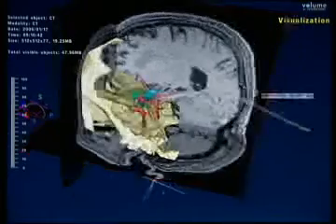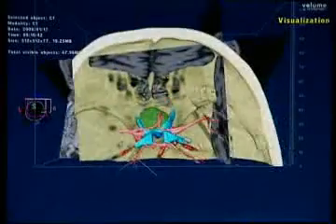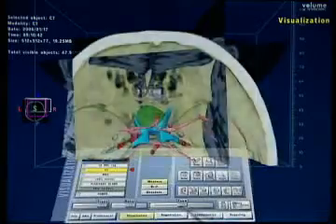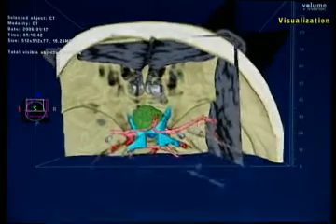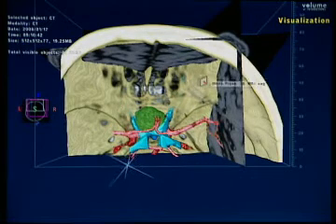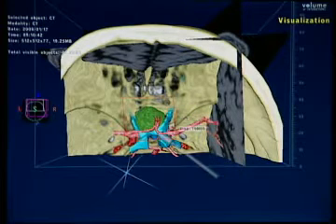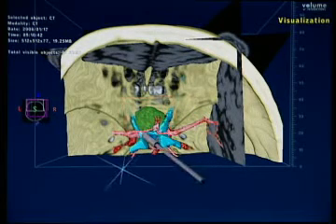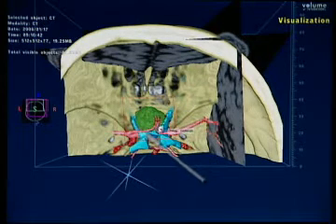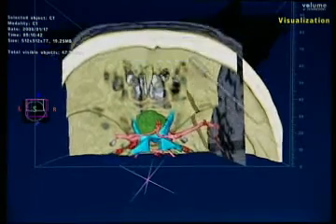So now how would you operate this? So as we said already, the tumor is in between the optic nerves. And since it's compressing the left one more than the right one, our thinking was, let's operate from the right, because then you don't have to deal with the already damaged left optic nerve while dissecting the lesion. You hit that nerve on the left side at the end of the operation. So we went from the right.